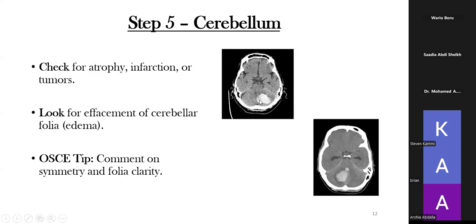So again, you can see this one is probably similar to this other one, but the difference comes in the side. When you're approaching this one surgically, you would approach from the right side. When you're approaching this one surgically, you would probably approach it from the left side. So it's very important for you to say where the lesion is.